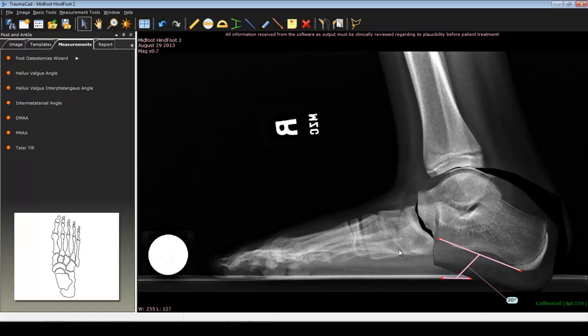So once we've accepted that we're going to correct our deformity to 20 degrees, we have to still address the forefoot. So how would you correct this? Now we can see our forefoot is not in good alignment here. So if we draw our lines again, we see that we have our bisection of our first metatarsal and the bisection of the talus is better than before. It was 37 degrees before, and it's now 18 degrees. So that just means our talus is in a better position. But how can we make these more parallel?